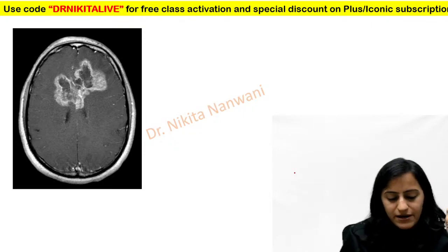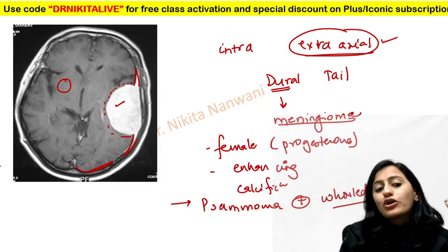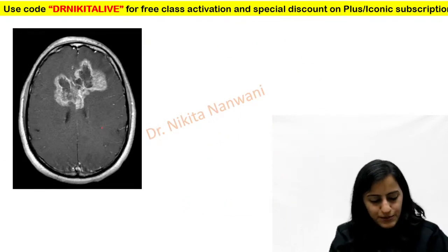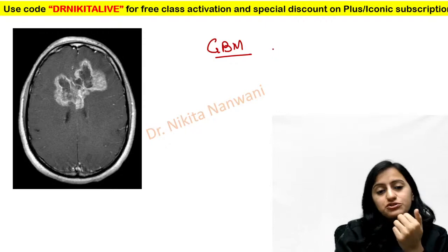Yes, that was MRI, Aishwarya. This image, if you are asking, you can see the black color surrounding the brain. This is an MRI, a contrast MRI. Very good. This is glioblastoma multiforme, the GBM, which is your grade 4, very aggressive tumor.